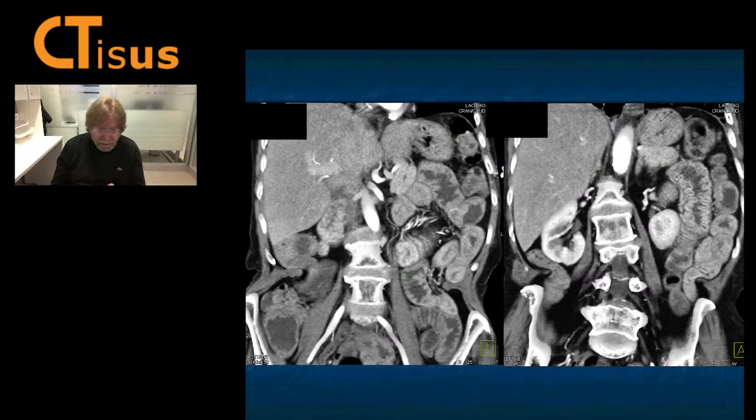Infectious, Shigella, some infectious thing. Usually you see more fluid, but you don't see the folds quite that thickened. Folds that are thickened like that, and then in jejunum, you've got to think about something like malabsorption. Something like sprue, jejunum prominence, thickened, dilated folds.